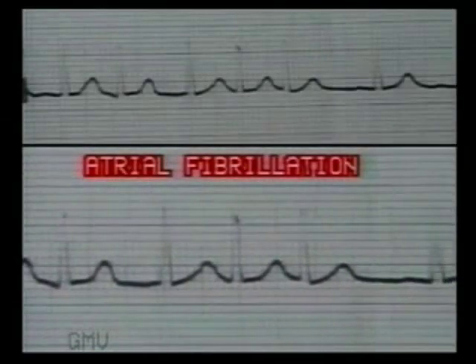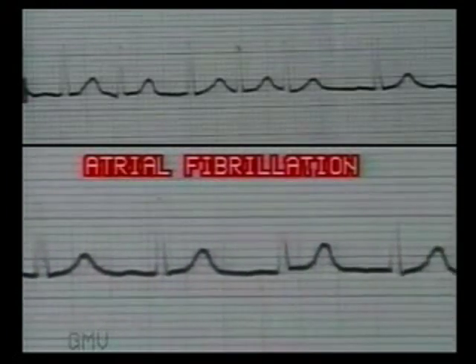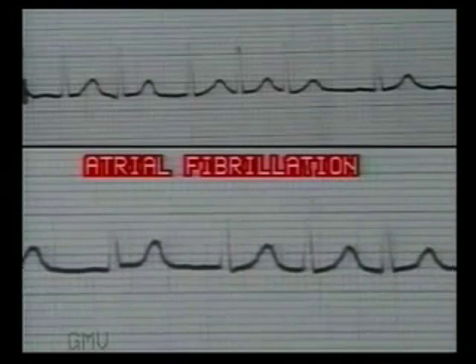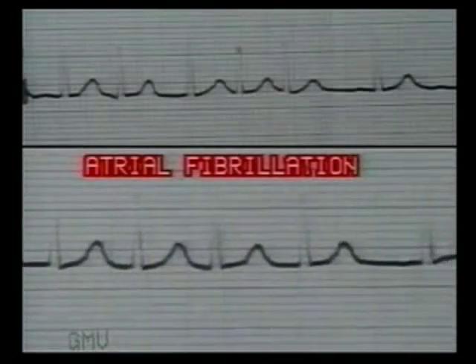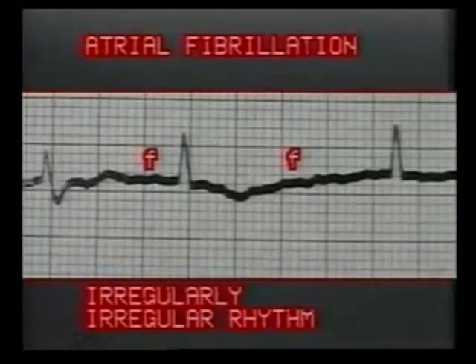This ECG shows an irregularly irregular rhythm. Fibrillation waves are not seen, but a very notable feature is the absence of P waves. This is atrial fibrillation. In atrial fibrillation, the impulses follow chaotic random pathways in the atria. So there are no P waves, but the baseline shows irregular fine waves termed fibrillation waves or F waves. Small f stands for fibrillation waves.